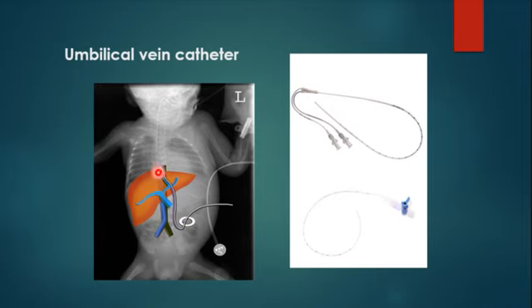You should see the tip of the catheter above the what? Above the diaphragm. Not diverticulum, sorry, diaphragm, yes. Above the diaphragm. If you see it lower in here or in here, this is the wrong position. As I said previously, this is very important.